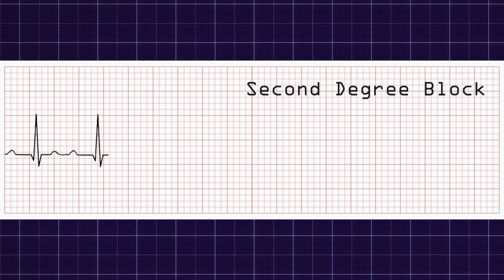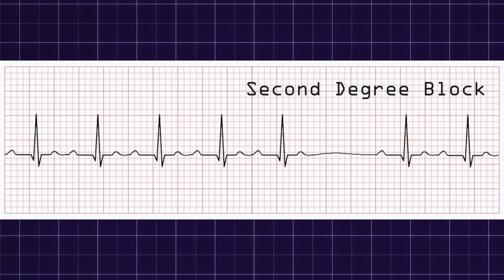And of course, the best reason is because we don't see that kind of depth on the NBRC exams. But you do need to notice that when there's a missing QRS complex, and notice after that missing QRS complex that the P wave will just fire again, and then hopefully the QRS complex goes back. So again, this is not a deadly thing.